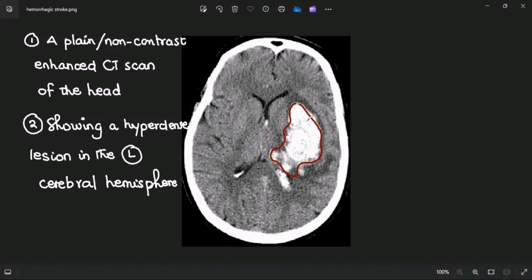This is a CT scan which shows, I can see some white thing here. Tell me what you can see. I can see this white thing here. What shall I say? Please, which structure is this? Which structure is this? The sinus. The frontal.